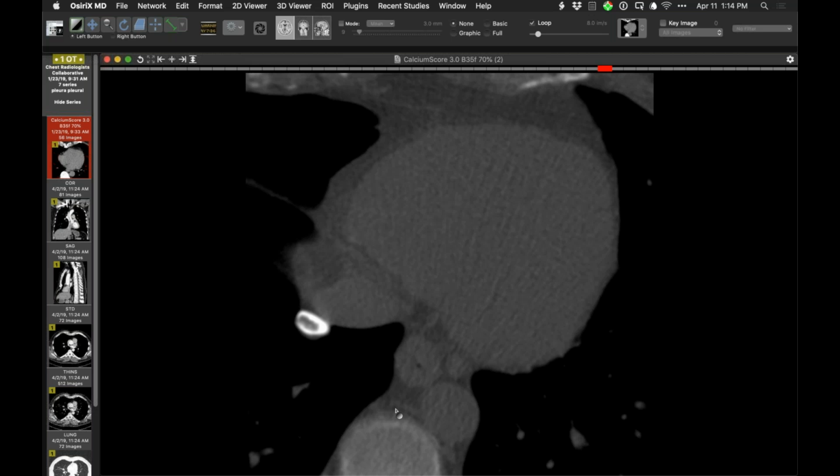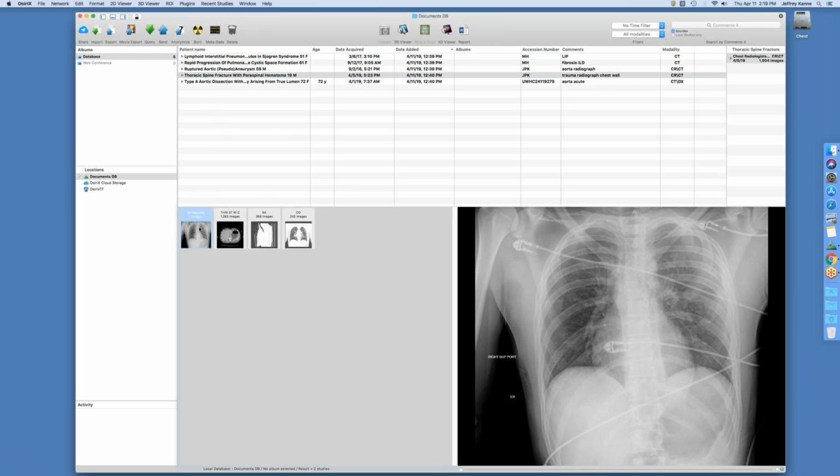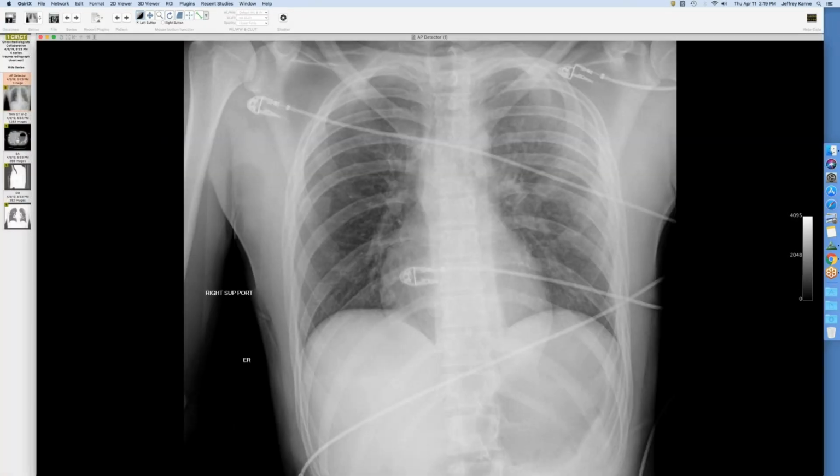Let's see. All righty. So this is a nice teaching case and good radiograph. Do you see my screen? Yep. So this is a young man who was in a motor vehicle crash at high speeds. Can't quite figure out, one note said he was restrained, the other one said he was ejected. So I don't know what the story was.